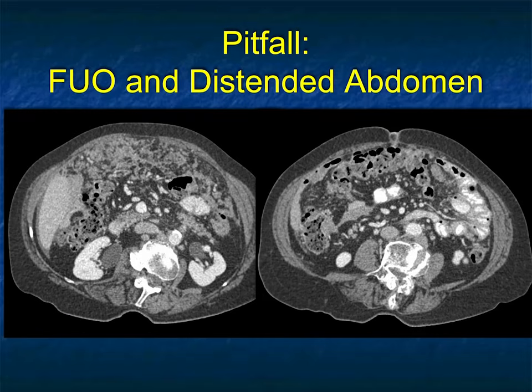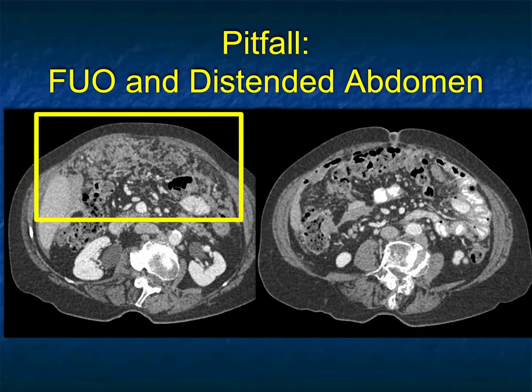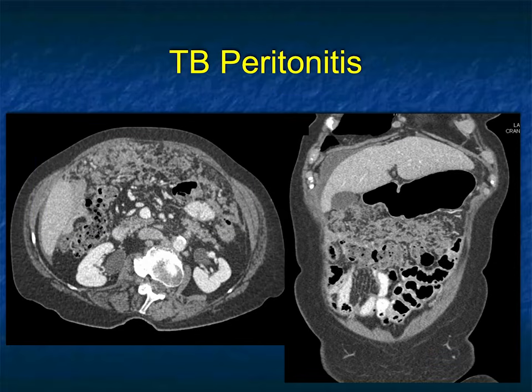The small bowel is really not very dilated, but what are we dealing with? Normally I would say to you, this is the same as the last case, pseudomyxoma peritonei. Think of stomach, look at the ovary, look at the colon. This was tuberculous peritonitis, and it's unusual. I was once shown a quiz case of a patient from Ethiopia.